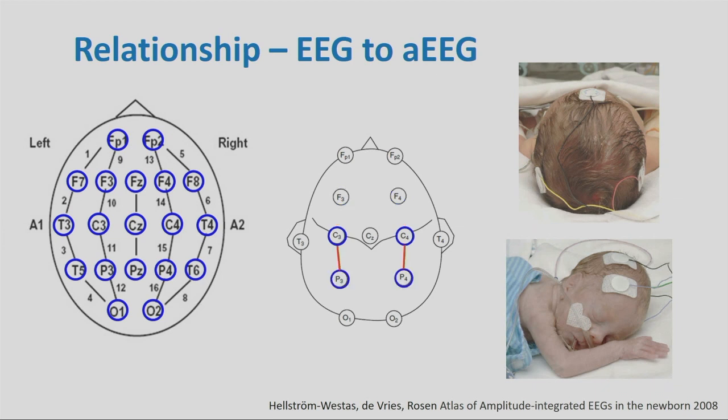We in Persist will use this, in Prevent will use this montage, which is the best to pick up seizures in the neonatal period. Most seizures occur over the central parietal and posterior region, so you should be able to pick up seizures the best.